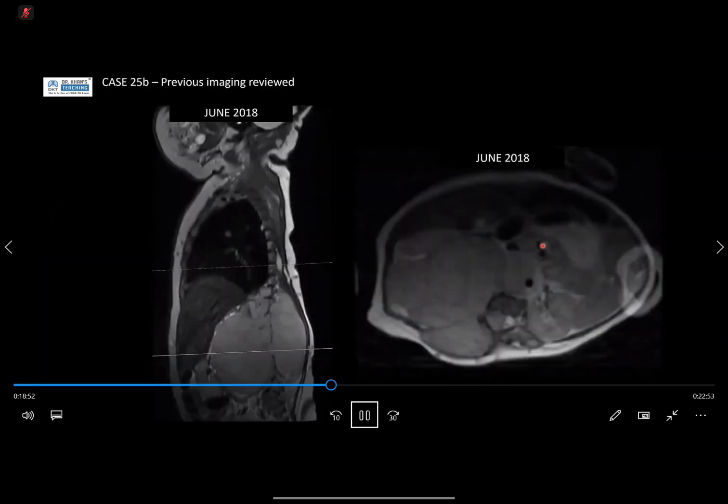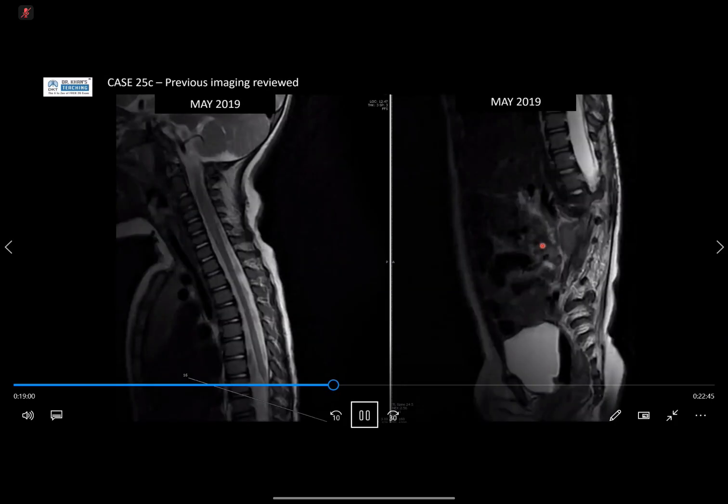So this just shows you that when you see neuroblastoma, the first thing you think of is bone mets causing pathological fracture. I think the next image that I show you is that the patient's been treated. You see this is your cord. The cord's changed essentially because of radiotherapy. You've got long-standing myelomalacic changes. So the patient's actually paraplegic because of the treatment, and subsequent to that, he's developed disuse osteopenia, and those are actually insufficiency rather than pathological fractures. But pathological fractures, given the history, would also be reasonable.